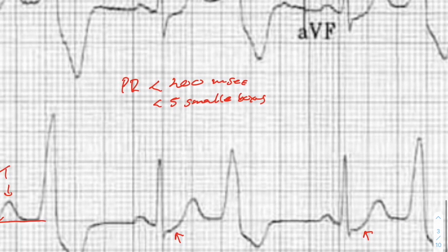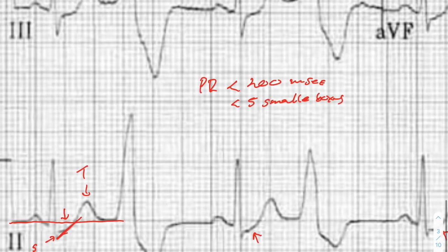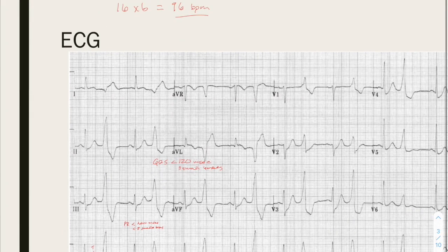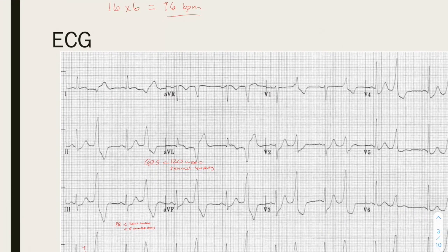And then you see this here. This actually is the ST segment of these abnormal QRS complexes, and there is a classic finding in this week's diagnosis that will explain this, but you can see that this is meant to be a QRS complex. This portion of it is actually the T wave, and the S is kind of buried in there. So we'll talk about that in just a little bit. So that is the reading of our ECG.